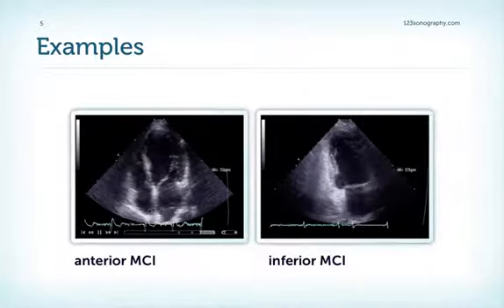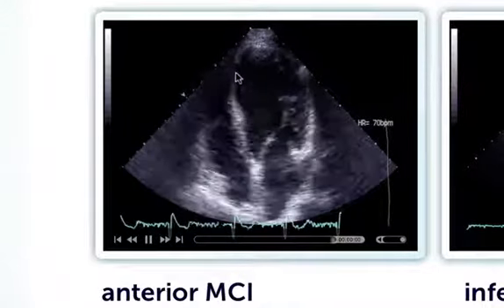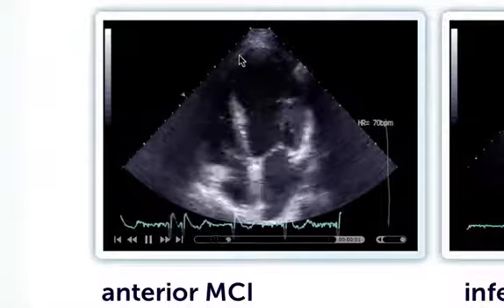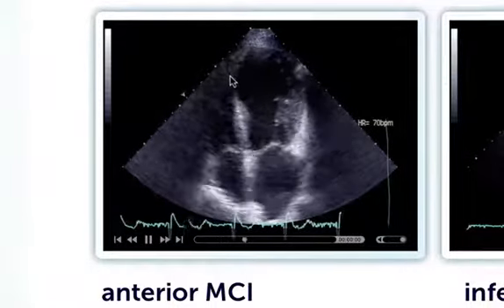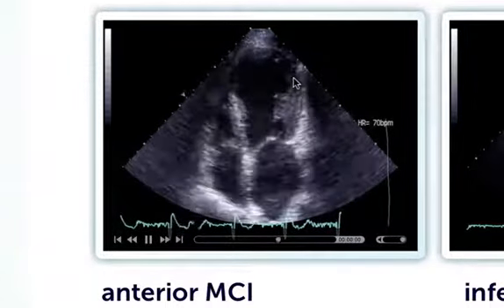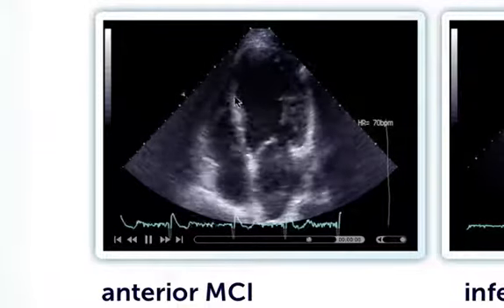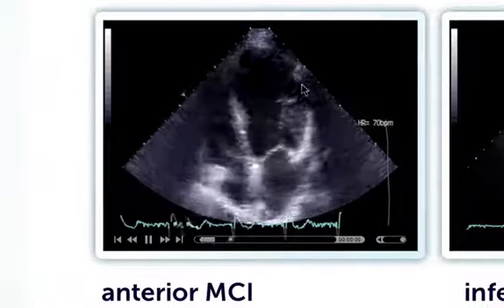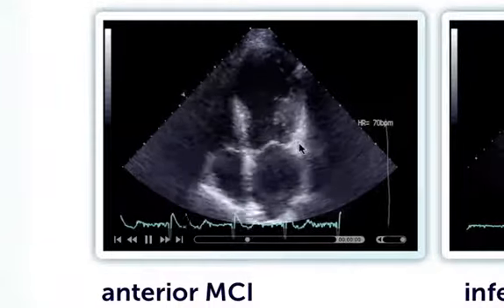Here are two examples. A patient with an anterior myocardial infarct. What do we see? Well, we see that the patient has akinesis of the apex. Important, there is motion, but this is only passive motion. There is no myocardial thickening here. So this is akinetic, the distal septum, and also the distal apex, distal lateral. We have hypokinesia in the border zone of the infarct, here in the mid-anterior septum, so somewhere in this region. And we also have hyperkinesis, which is compensatory in the mid and basal lateral wall.